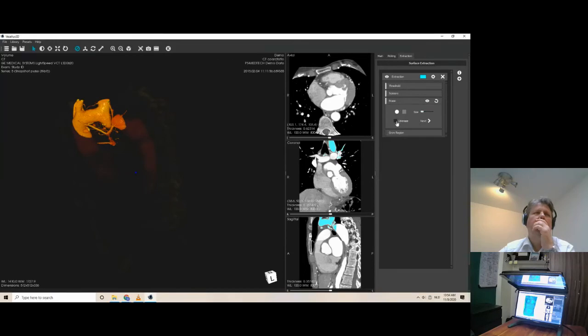Of course, people make mistakes. We have an unerase ball, it turns green, and you can unerase whatever you want. For easiness, I leave this out, but you can make your model more refined.